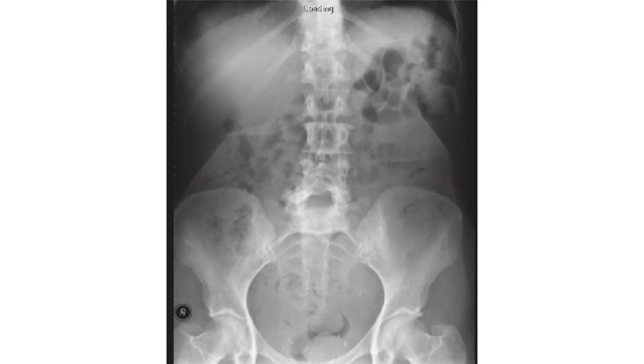So we are going to talk about again how to read an abdominal X-ray, which is very important. Then we show you more fluoroscopy study and what is a fluoroscopy and the main complaints about fluoroscopy. And last, we talk about appendicitis, specific appendicitis in ultrasound.